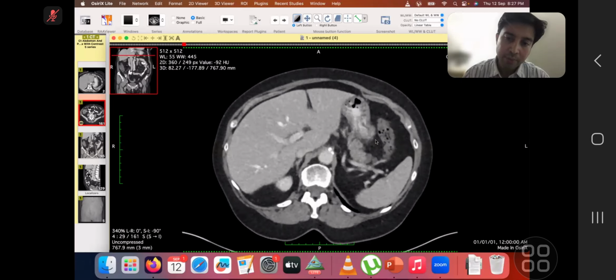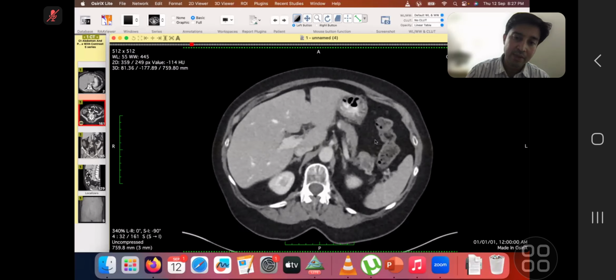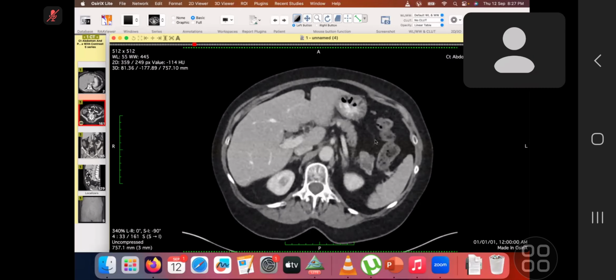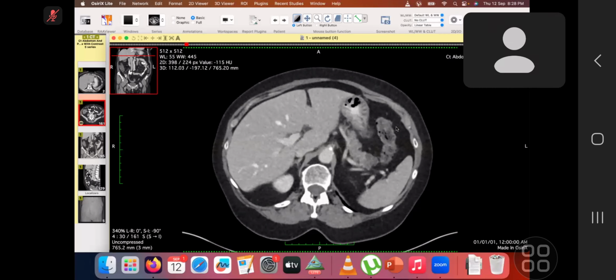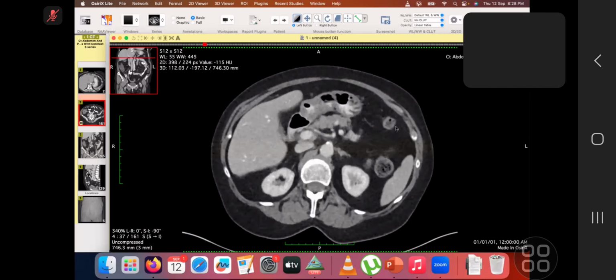How do you propose that we would do a biopsy for this mass, a CT guided biopsy? Or ultrasound, if it's feasible? Is there any window which you see for biopsy on these images? Okay, yes, let me.